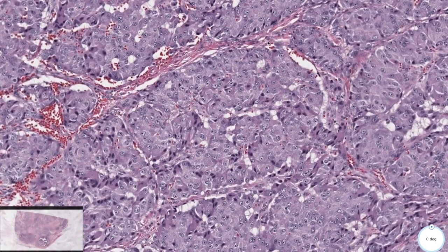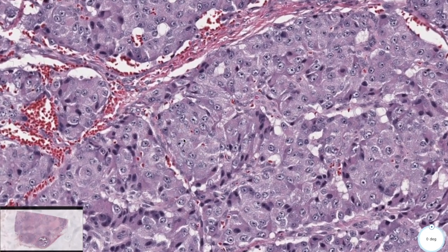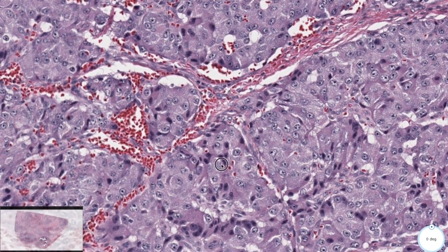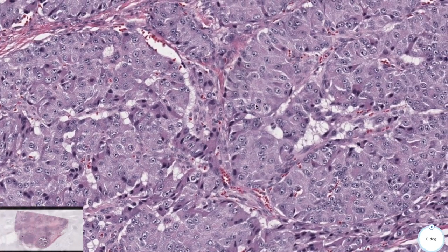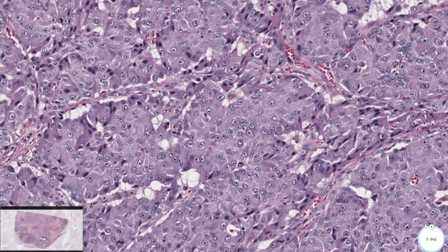We're seeing these fibrous septa surrounding this lesion. The cells look maybe a little myxoid, but with very salt and pepper like nuclei. And you could see that really well here. Look, it's very salt and peppery. The nucleoli are very prominent. There's some nuclear clearing. The cytoplasm is very faded and eosinophilic.